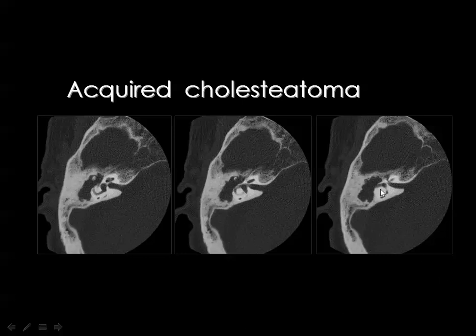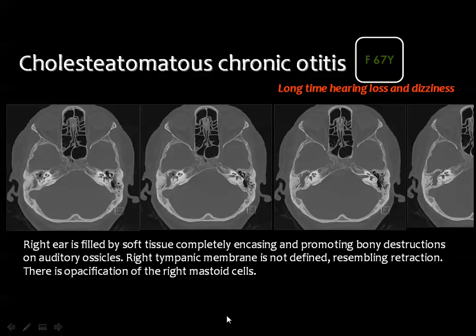you may feel that there is some erosion of the lateral semicircular canal, and this erosion will result in communication between the inner ear and the middle ear, and this is known as labyrinthine fistula.